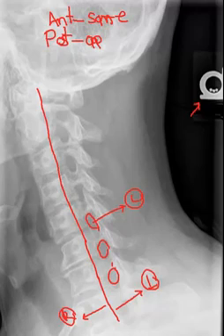So if we had to guess which views, or which patient position, could have been used to result in this radiograph, well, if an anterior oblique was taken, it would have to have been a left anterior oblique, because we know that anterior obliques show us the same side IVFs. We are visualizing the left side, therefore left anterior oblique is a viable option.